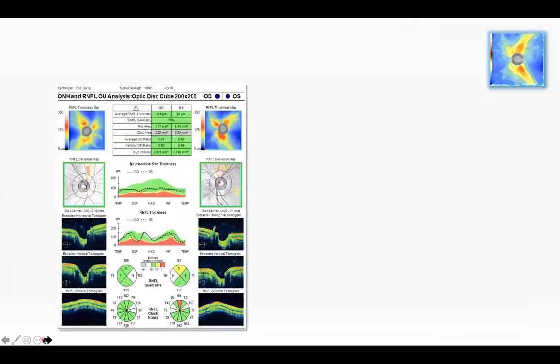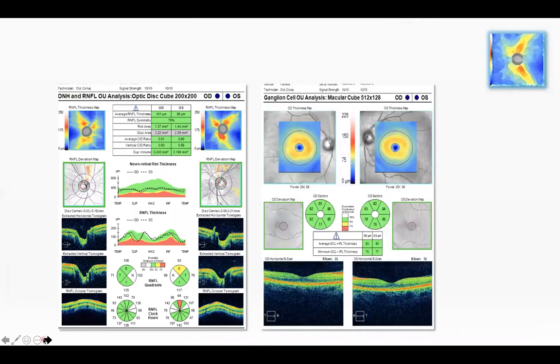What do you think? Are these superior RNFL defects real damage? Macular scans look normal. The TSNIT plot shows a typical exaggerated two-hump pattern with a depression in between, and the machine thinks this is an RNFL loss at this point. You can see two humps and a depression in the middle.